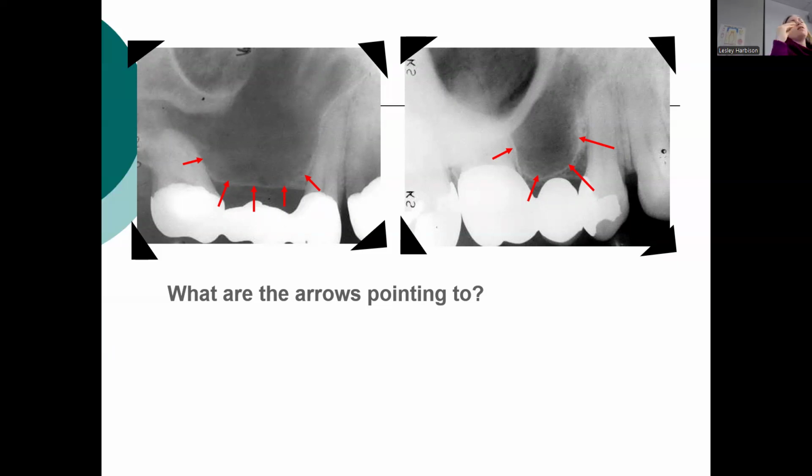And so the bone has thinned out and gotten very, very close to the sinus. So this is all sinus here and here, but do you see this structure here and this kind of swoop? It's very radiopaque here. Those are the zygomatic process. And then this is pointing at the maxillary sinus. You see that differentiation?